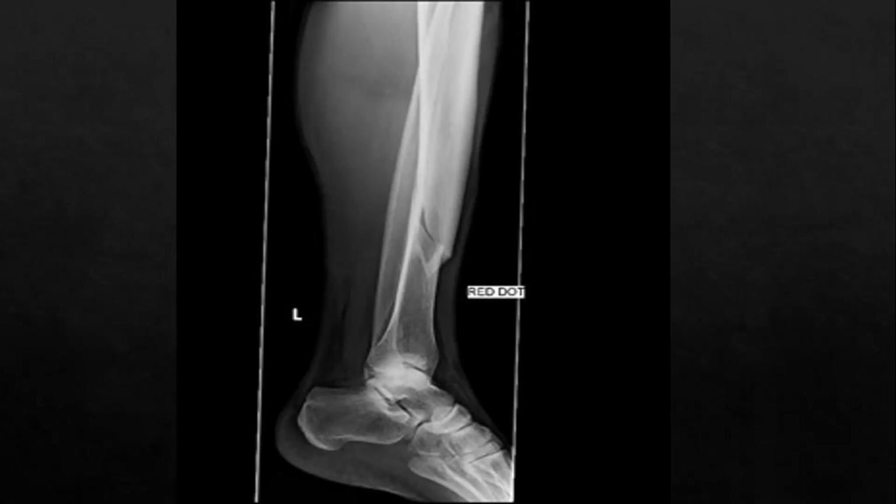Moving down through the bone, I think I can see a tibial fracture in the midshaft region, and the fracture looks slightly oblique, so I want to say it's maybe a spiral fracture. Moving further down to the ankle joint, I can't say for certain, but I think the ankle joint looks intact, and that's it.